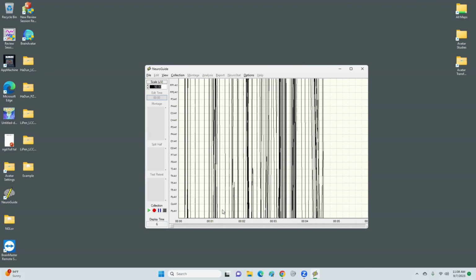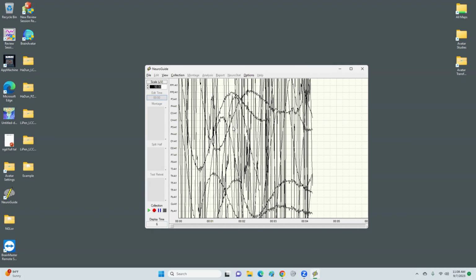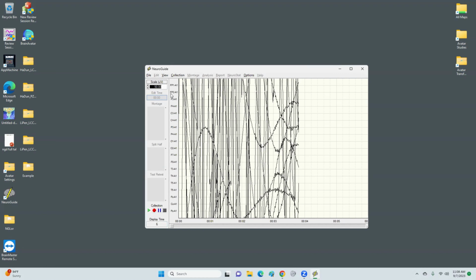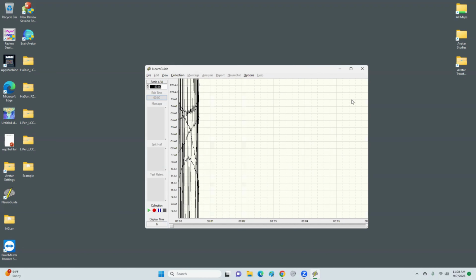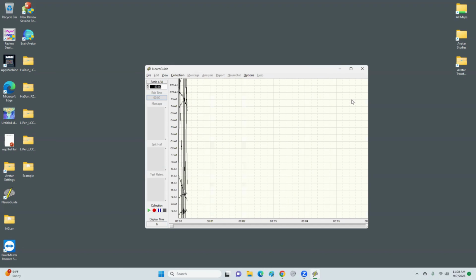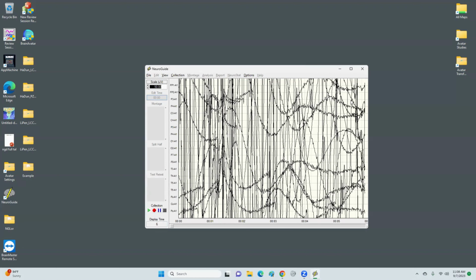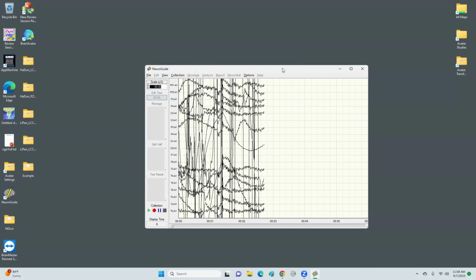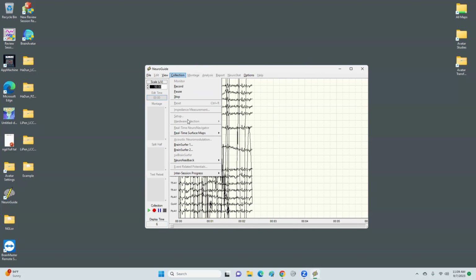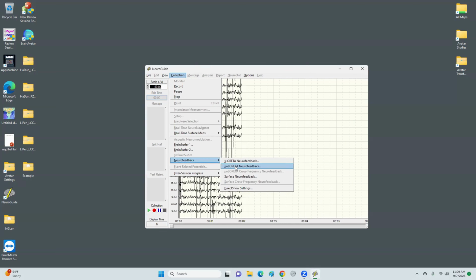Now we're at the point where there is noise in the room. If you had your client hooked up, connected to the cap, you can check all of your impedances and make sure that everything is nice and clean. If you don't have someone hooked up, you can set your protocols up ahead of time, which I would recommend, because this is a little bit of a process. You can come back over to collection. Now we're going to come down to neurofeedback. And we're going to choose swLORETA.